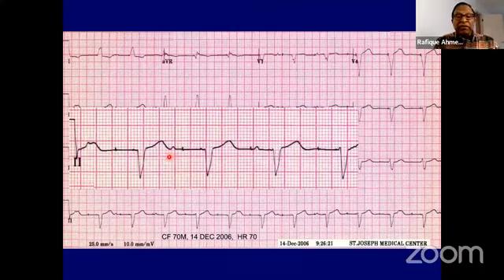And the other part, the sensing part, is that if it had sensed it, it would have paced the ventricle synchronized. So it is not seeing the P wave at all. And this is probably random, because this P wave and this P wave look like just random atrial pacing. I don't believe this. Again, you can see this one did not capture.